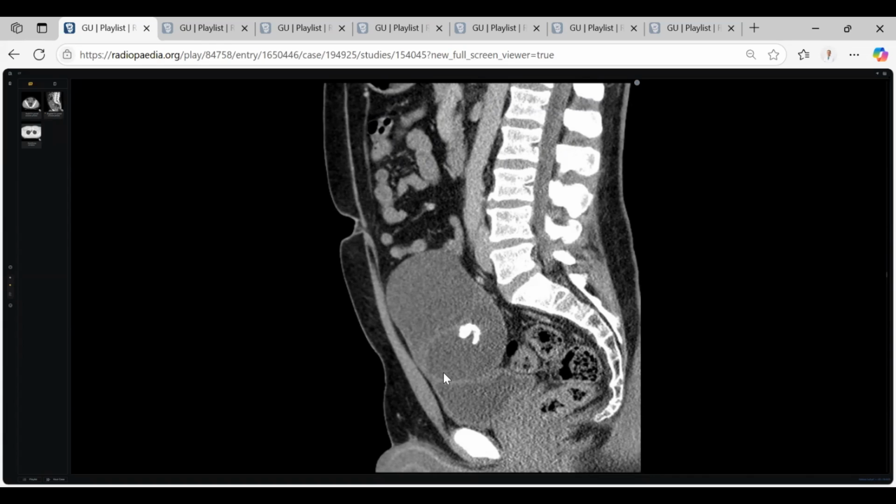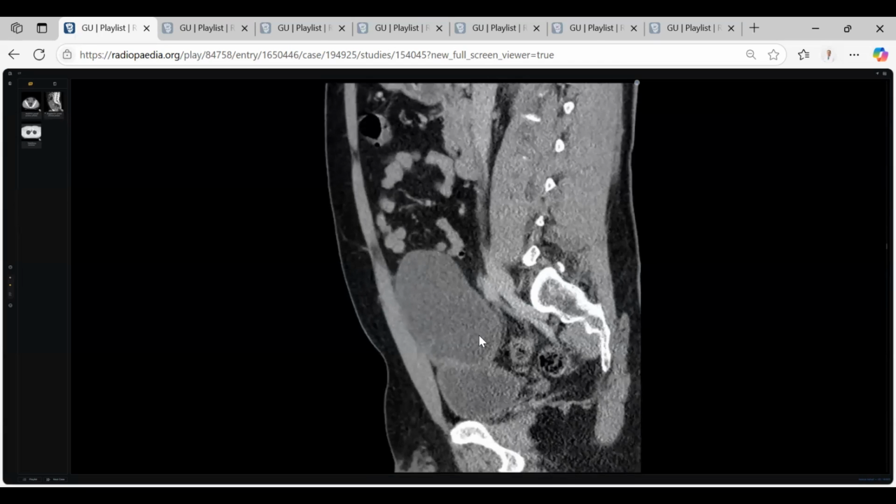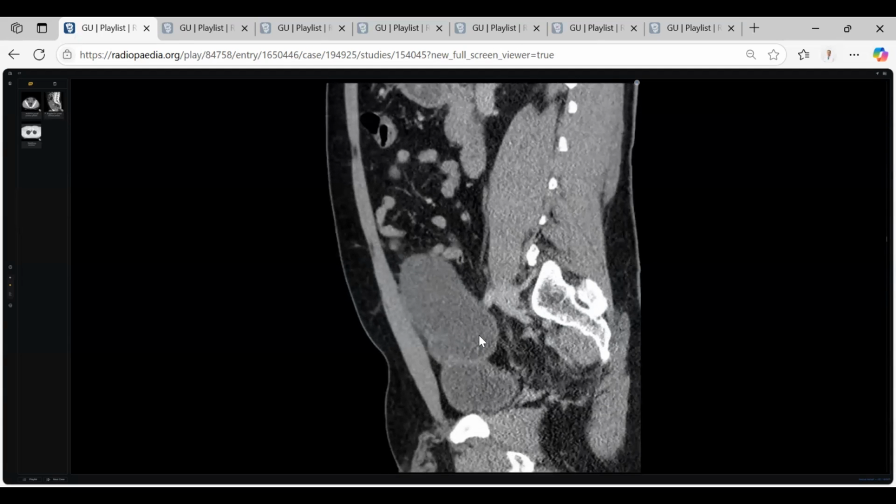Sir, I do not remember. The urachus. Yes, the urachus. And what happened here? Is this just a sinus or something more than a sinus? Look, it has a solid component. So, sir, it may progress into adenocarcinoma because it's more common in urachal sinus. There are chances of adenocarcinoma.